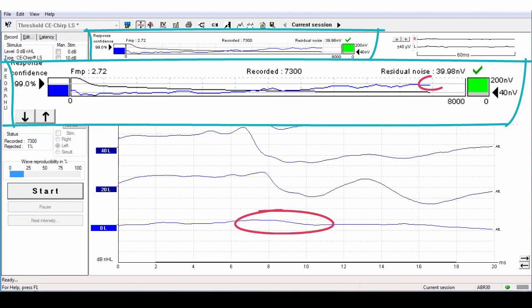My FMP is sloping up. It is slowly getting there. It all fits into the nice picture. So I would in fact place a marker for peak 5 on that bump, but I wouldn't use the word clear. I would just say, okay, 0 dB was heard, so in this case the threshold must be somewhat lower than 0 dB.